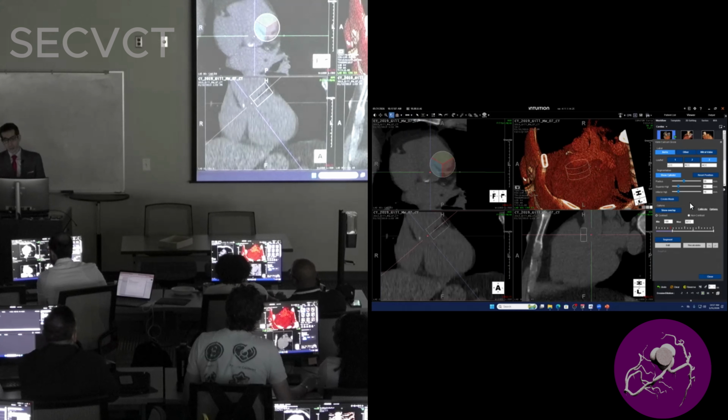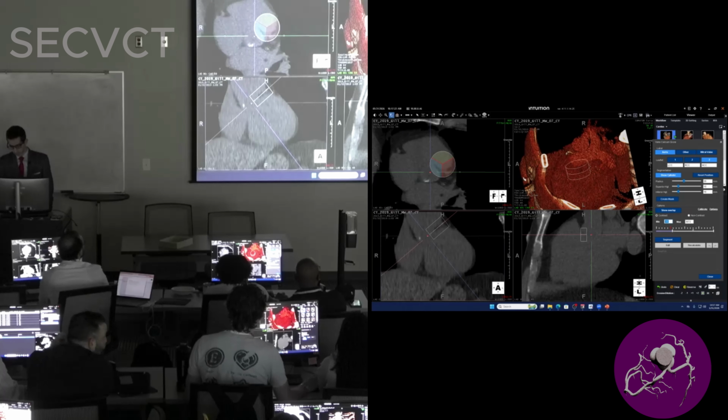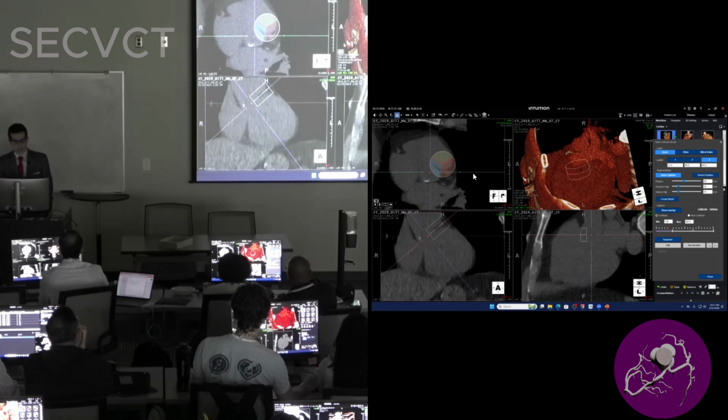On the right side, you see options here. This is the calcium score following the Agatston units, and the 130 Hounsfield unit is the cutoff, so you have to select it in your setting. You see the contrast. Everyone sees that. You see my cursor. You need to change this number to 130. And once you save it once, it should be in the system, by the way.